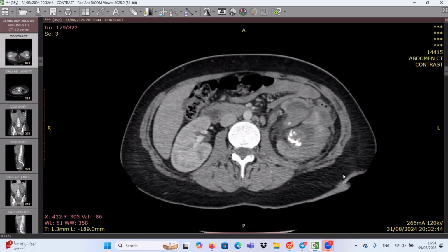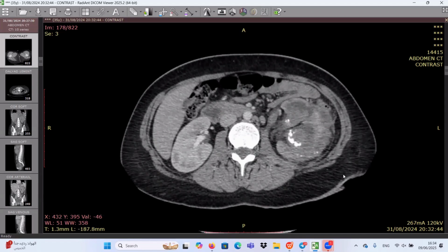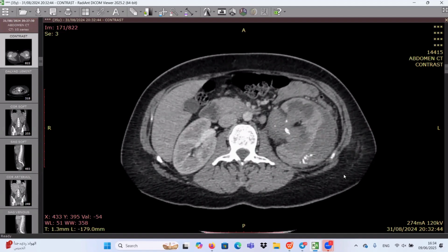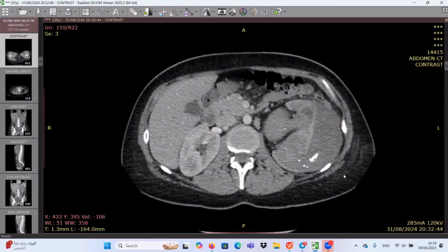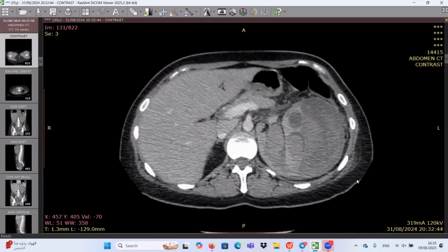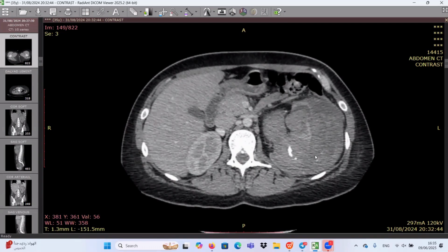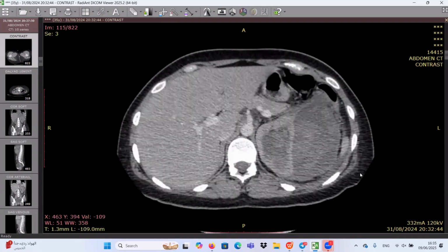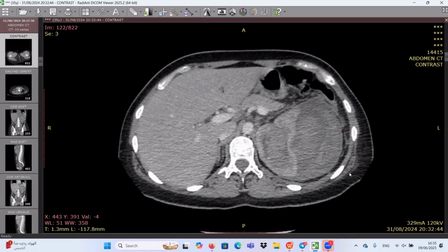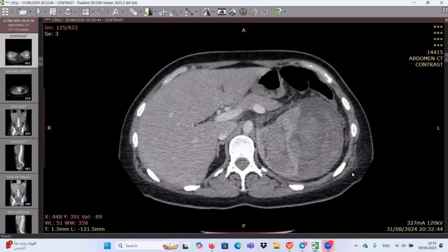It looks like stones, and post-shattering as well, small stones, fragmented stones. What do you have more? What else? Are there any more findings? Yes. You did very well.